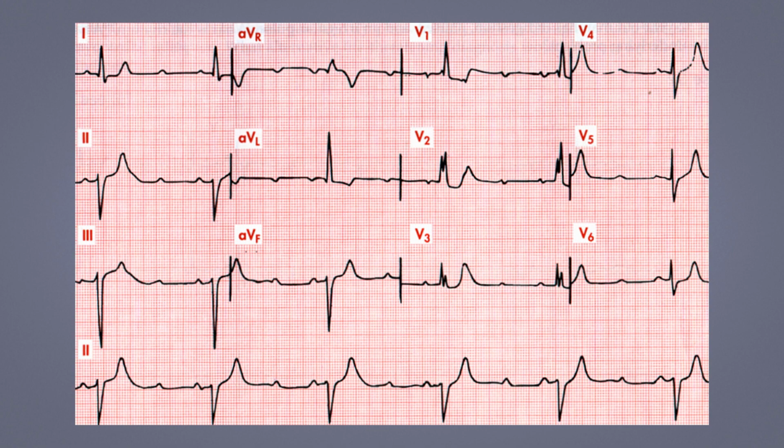Upon initial examination of the electrocardiogram, we can readily observe that the atrial rate is different from the ventricular rate. If we measure the PP intervals, which indicate the atrial frequency, we notice that some P waves fall into the T waves, rendering them invisible. Additionally, there is a clear 3:1 relationship between the P waves and the QRS complexes. In other words, for every 3 atrial complexes, we're seeing 1 ventricular complex. So we're dealing with a 3:1 atrioventricular block.